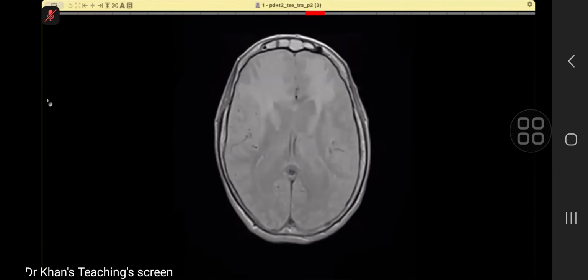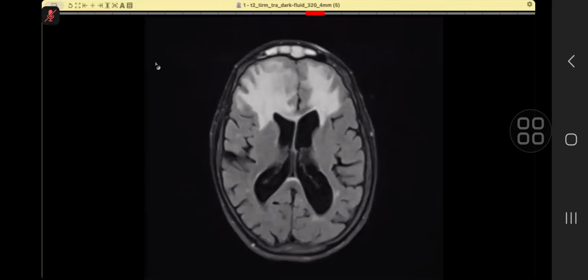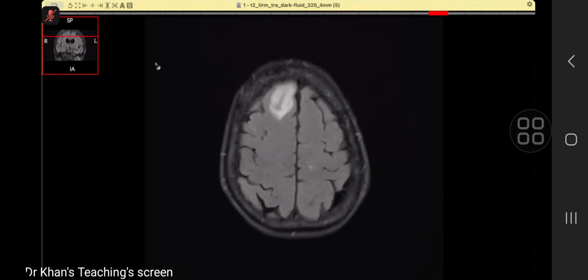So what we did was that we did an MR. So I'm showing you an MR. Okay, sir. These are FLAIR images. You want me to scroll for you? Yes, sir. So I'm going superiorly, all the way till the top. I'm coming back now.